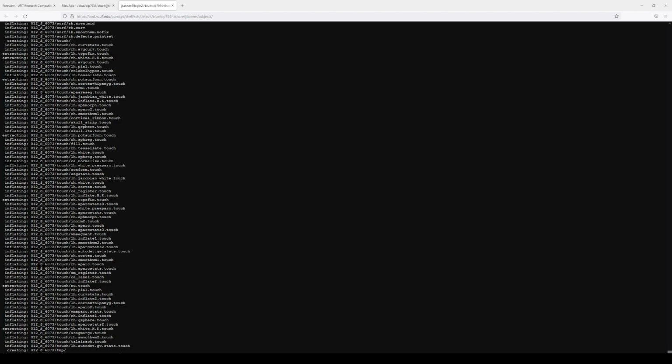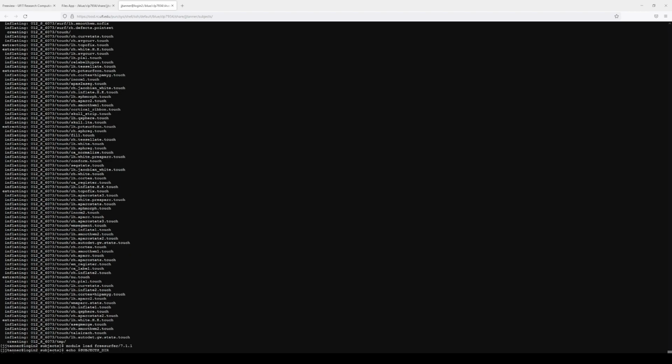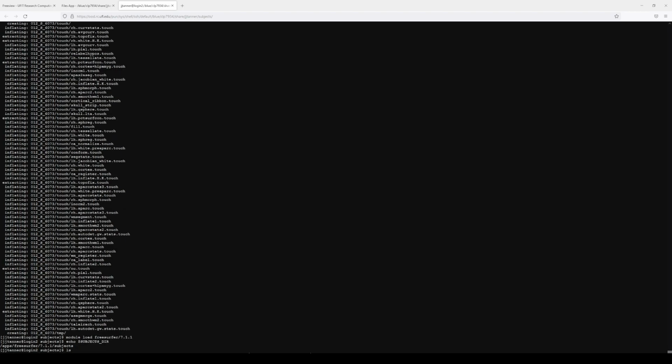And I just want to show you, I'm going to echo subjects dir. And that's apps FreeSurfer 7.1.1/subjects. So that is a location on HiPerGator that we have no access to write to. So that's why we need to set a subjects directory somewhere else. So in this case, I have the subjects in here. Again, this add FreeSurfer zip. I had unzipped it. And now these are the different subjects here in this directory.